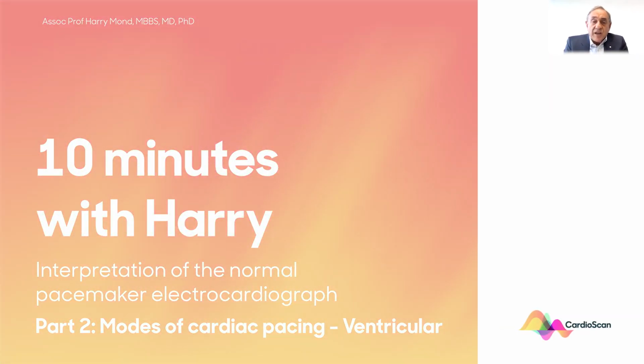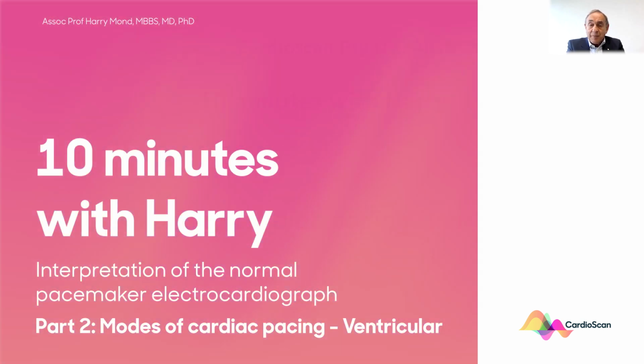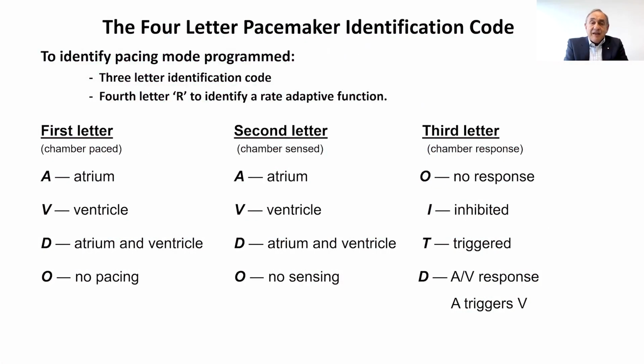Once again, we are talking about the interpretation of the normal pacemaker electrocardiograph. And today I would like to summarize the modes of cardiac pacing and give emphasis to ventricular pacing, single chamber ventricular pacing. There is a 4-letter pacemaker identification code that has been present for approximately 30 years.